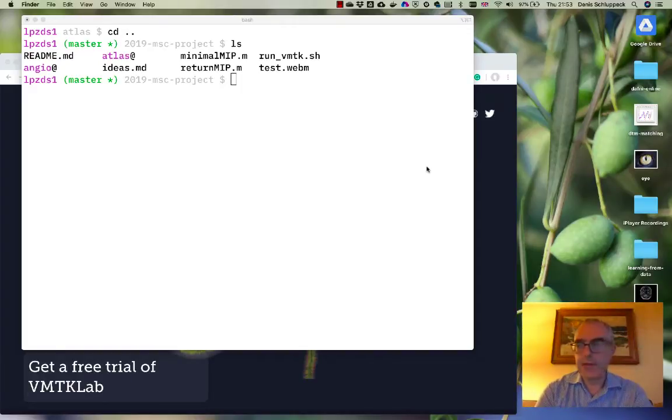All right, so the next step I think to do here would be to look at the atlas that comes with this paper that describes the average across hundreds of these magnetic resonance angiograms. And so I've downloaded the files for that already. They were a little bit hidden away on some Figshare site, just to show you where that is.